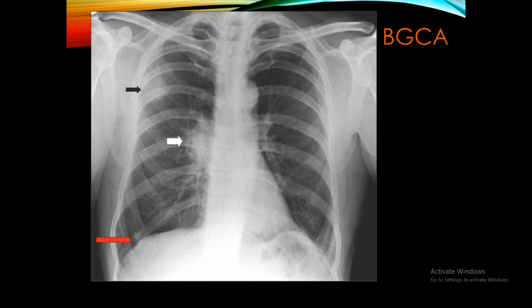أما الconsolidations هي ممكن تكون كsecondary features، الميتاستاسيس كان ممكن يكون كsecondary features. in this chest X-ray الكي finding هي unilateral hilar enlargement with spiculations يجي معها patch، يجي معها nodule، يجي معها mass، يجي معها pleural effusion، diaphragmatic elevations، mediastinal lymphadenopathy، right paratracheal lymphadenopathy whatever the presentation. الكي finding هي spiculated hilum.